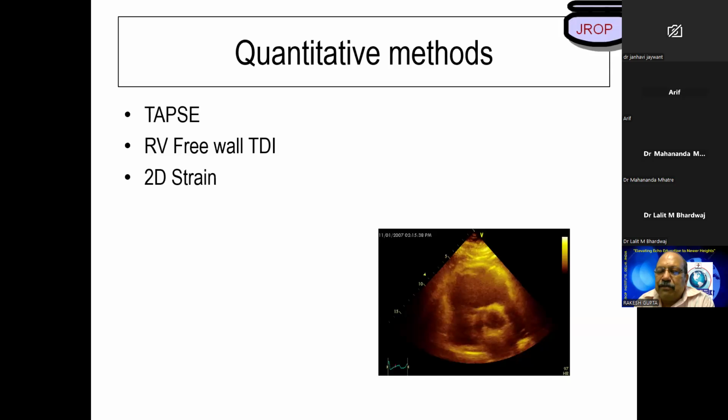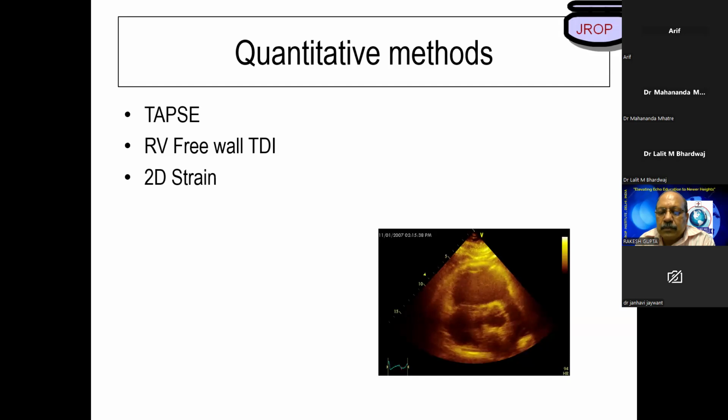All right, Arif, go back again. Sometimes while measuring the LVEF in M mode, septal thickness appears after the posterior wall thickness. Is it because of LBB? Sometimes while measuring the LVEF in M mode, septal thickness appears after the posterior wall thickness. Is it because of LBB? Okay.